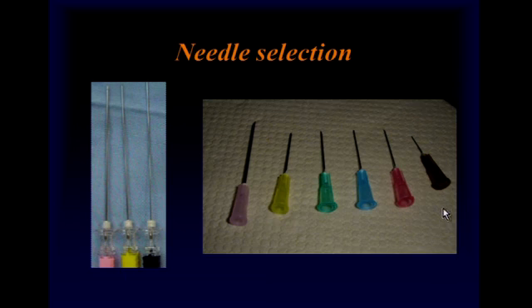These needles could be small or they could be large in length, as for example here we have spinal needles which are longer in length. It all depends upon the depth at which you are working. For an FNA, the finer the needle, the better is the yield for the cytologist. So one should use as fine needles as possible. This is very important.